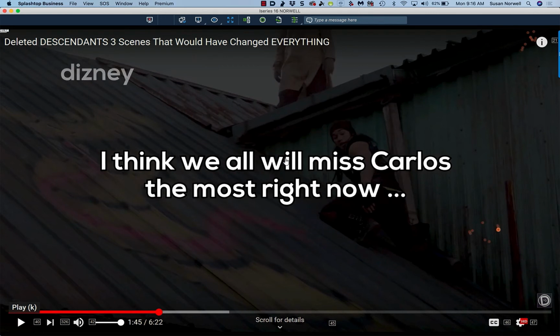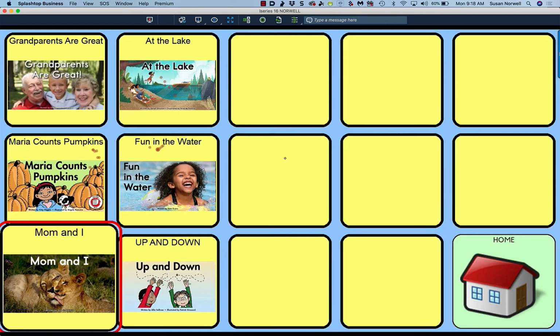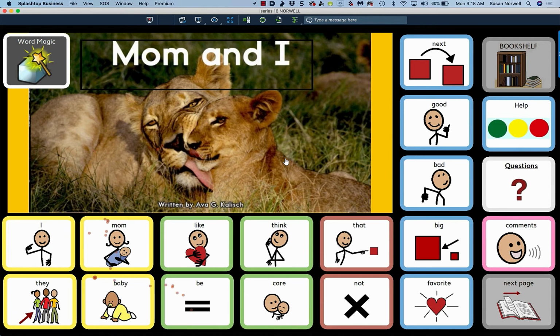And if you were to put on a book, you could take a look at that also. So let's do that next. All right, so let's take a look at using eye gaze with a book. And so I'm reading the title of the book, and you can see my eyes tracking across it. Now, the thing about using Gaze Viewer running through my computer is it's not really letting me access the device.